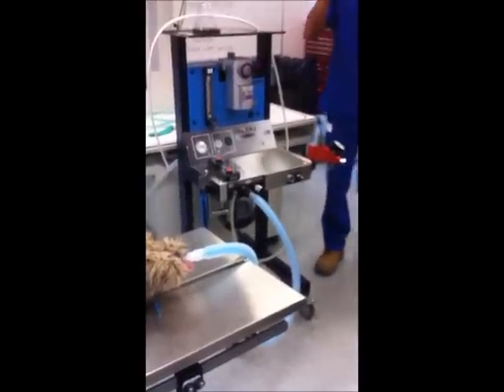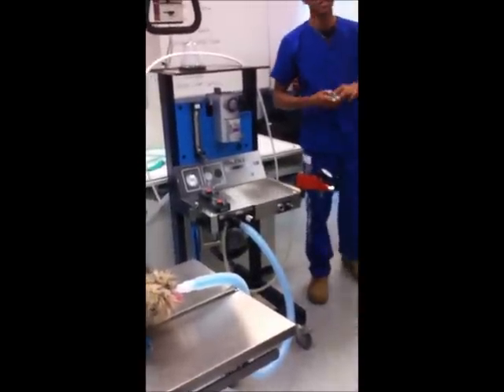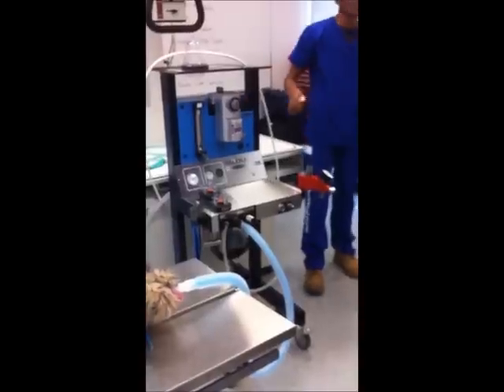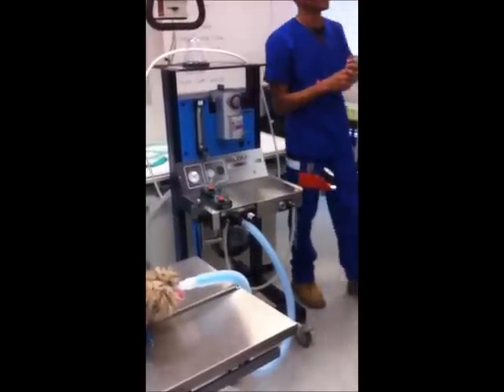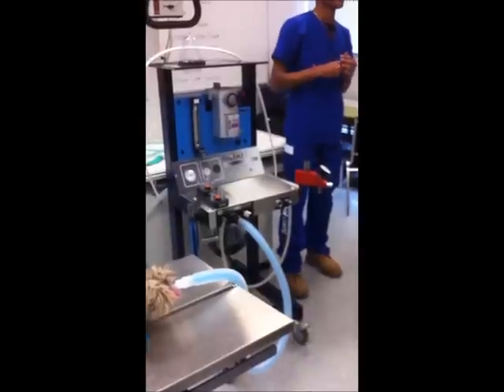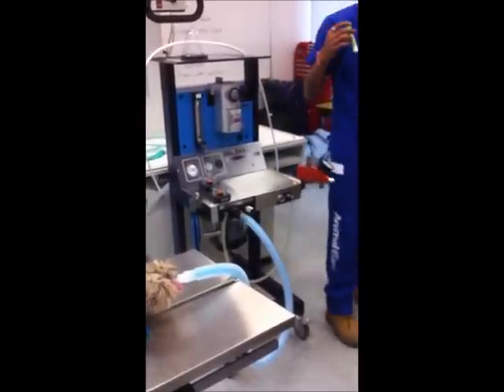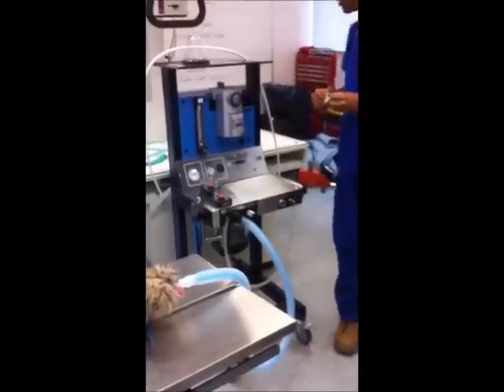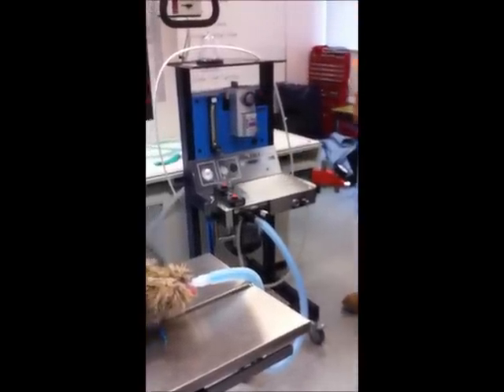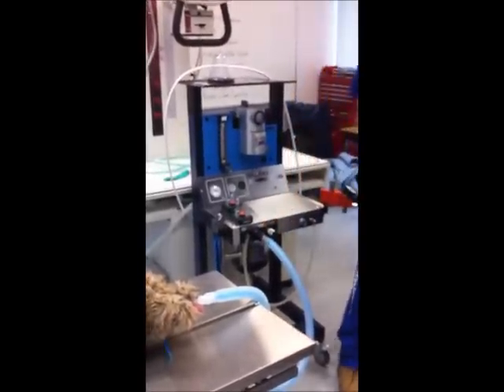Okay. So from your endotracheal tube, gas gets into your patient because he's inhaling. He's now anesthetized, knocked out. Now he breathes out. Where does the gas go? Into the clear one. What's the name of the clear one? The exhalation tube. To your exhalation tube, and that is now leading back to your circuitry.